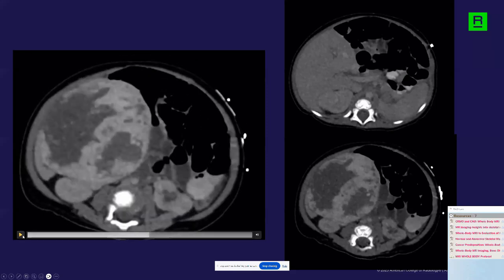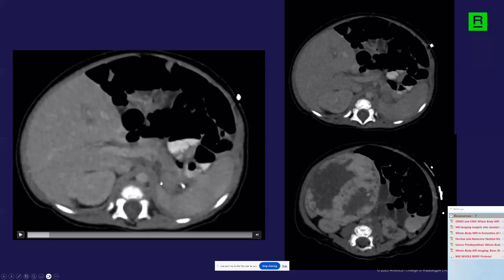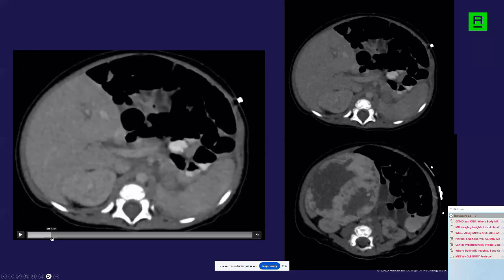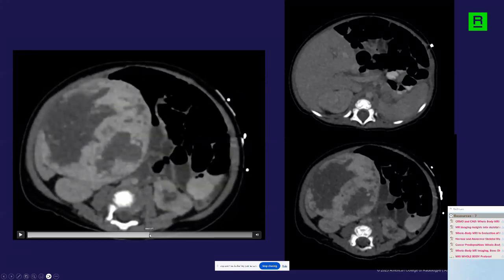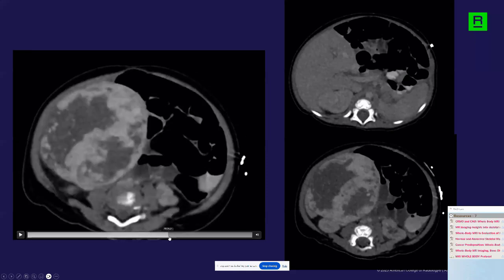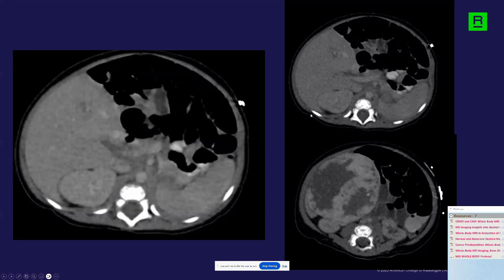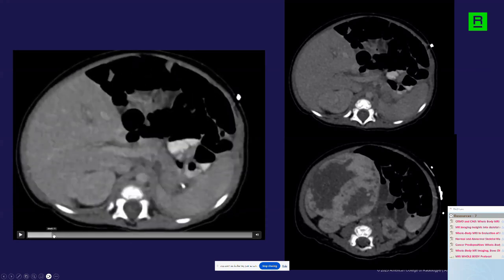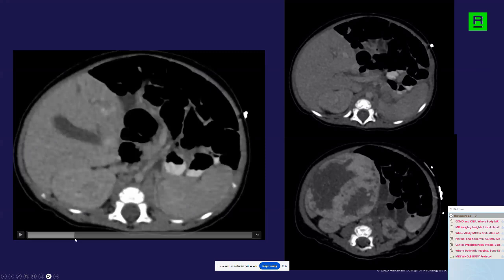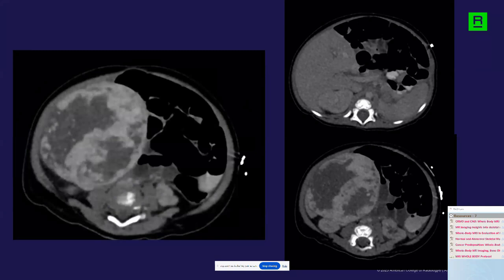Also notice on this lesion, if you take a look at the aorta coming down, here's the aorta here, and it tapers as we go down inferiorly after the mass. So the aorta is tapered, suggesting that it has a pretty large vascular flow to this lesion. And then I'm showing you this image. Doesn't project really well, but the hepatic veins are also enlarged as we go back to the IVC, suggesting this is a large vascular lesion.